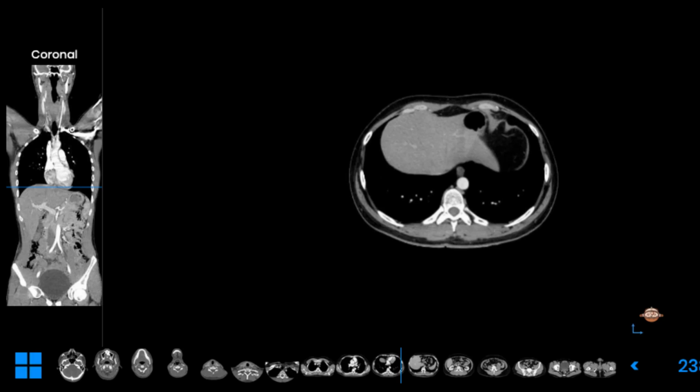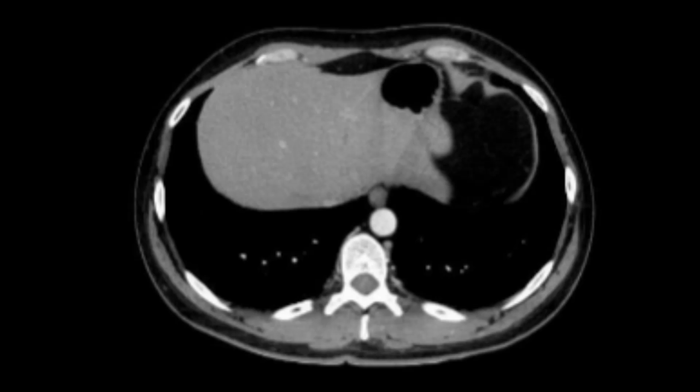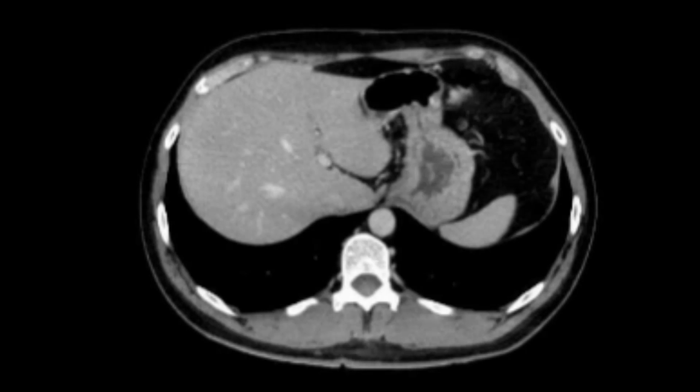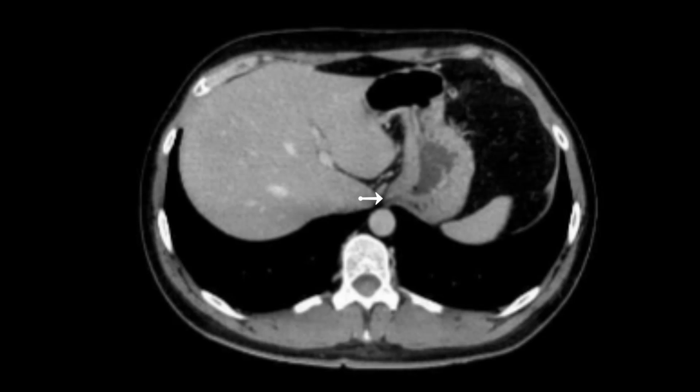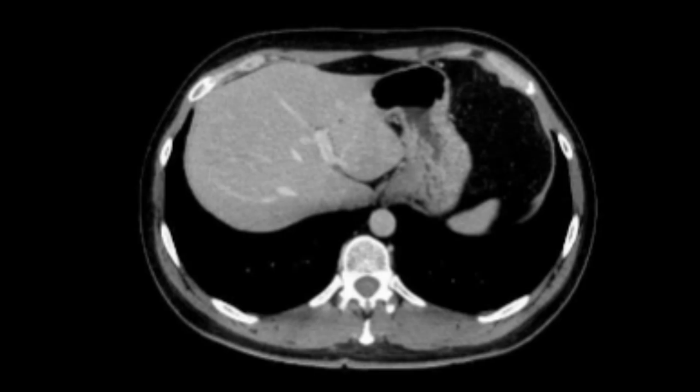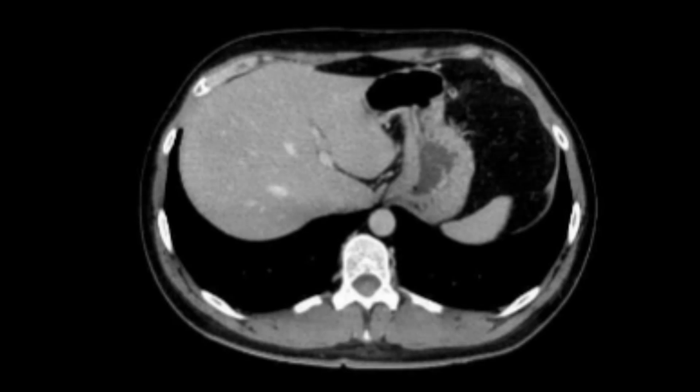The same organization all the structures have on the CTs. You see the esophagus running down just in front of the descending thoracic aorta. As soon as the esophagus pierces the diaphragm, right now it opens into the stomach. Here we are at the level of the gastroesophageal junction, and you see the body of the stomach with the greater curvature and lesser curvature, with the greater omentum and lesser omentum in front and behind.